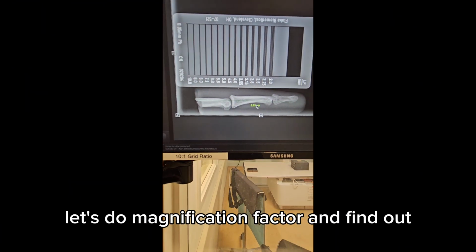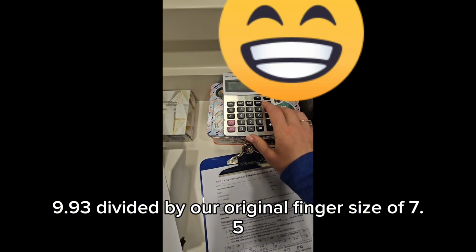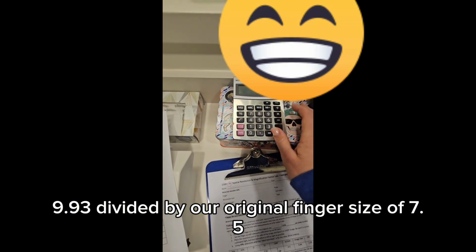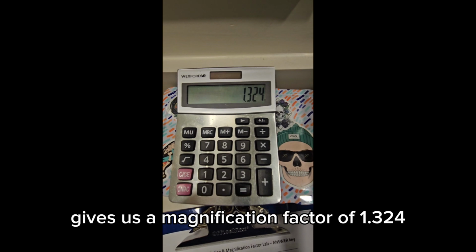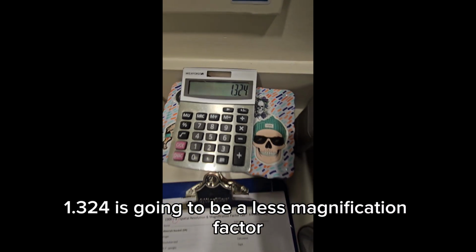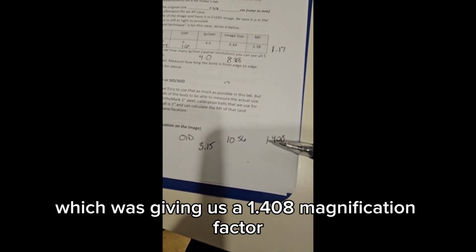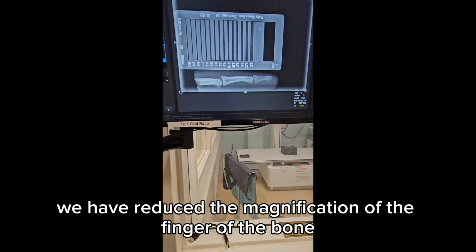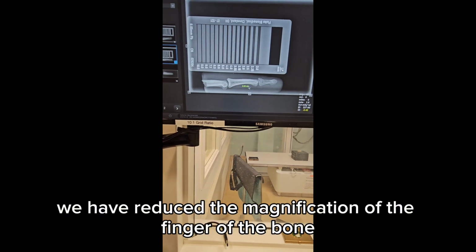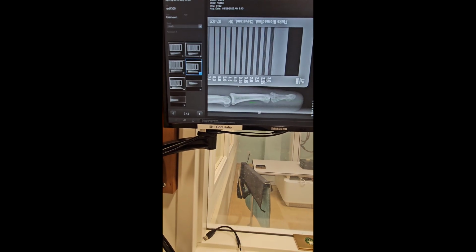Let's do magnification factor and find out. So again, 9.93 divided by our original finger size of 7.5 gives us a magnification factor of 1.324. 1.324 is going to be less magnification factor than it was when we had the OID, which was giving us a 1.408 magnification factor. So by backing up SID, we have reduced the magnification of the finger, of the bone, which means distortion has gone down, which means what happened to spatial resolution?